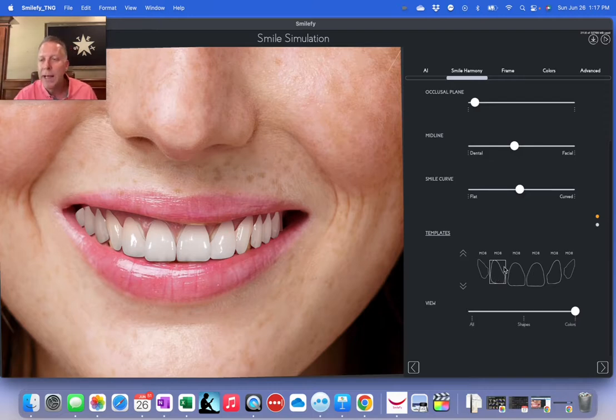If you go highlight this box, and then inside there, you click with your mouse key and slide up, and it's kind of touchy. Sometimes it works, sometimes it doesn't. I haven't really found out how that works precisely every time. Or you can slide it down, and you can see that the other teeth are, there we go. Sometimes they click, and sometimes they don't. Anyhow, you can see that I can just change the laterals in this case, but keep the centrals and the canines right where they should go.